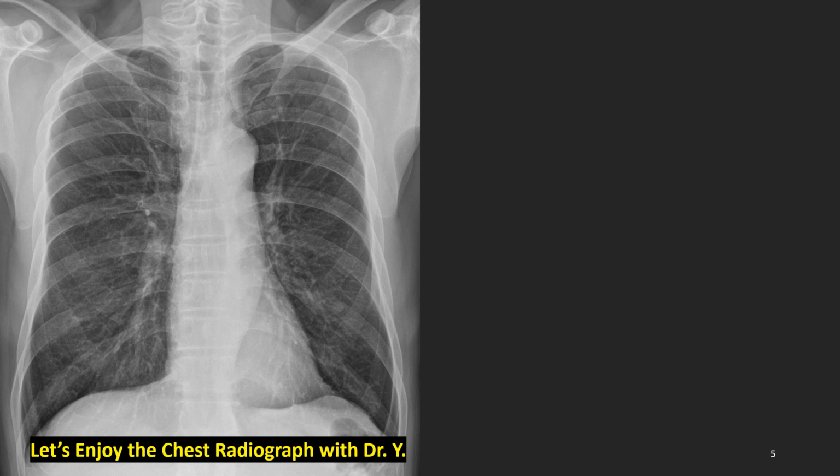This is the second case with lung cancer. This patient also has lung cancer. How do you feel about this image? I found nothing abnormal with this patient's image. Maybe you too. I'll explain why about this case later. There are no abnormal findings in this film. Let's contemplate.